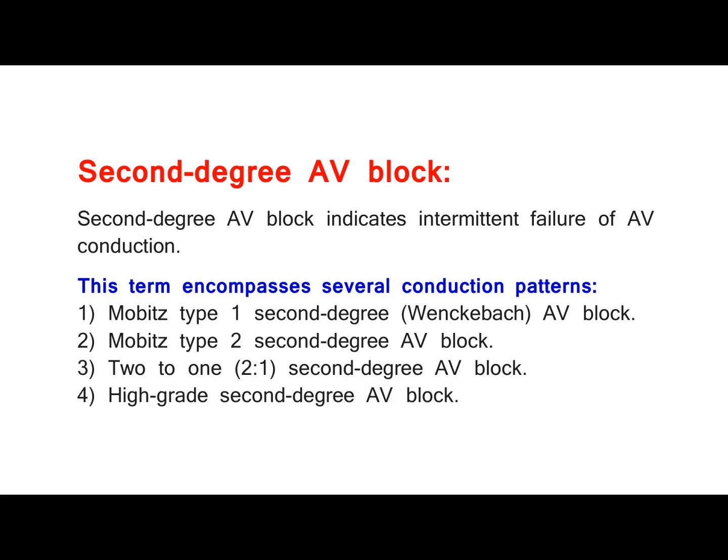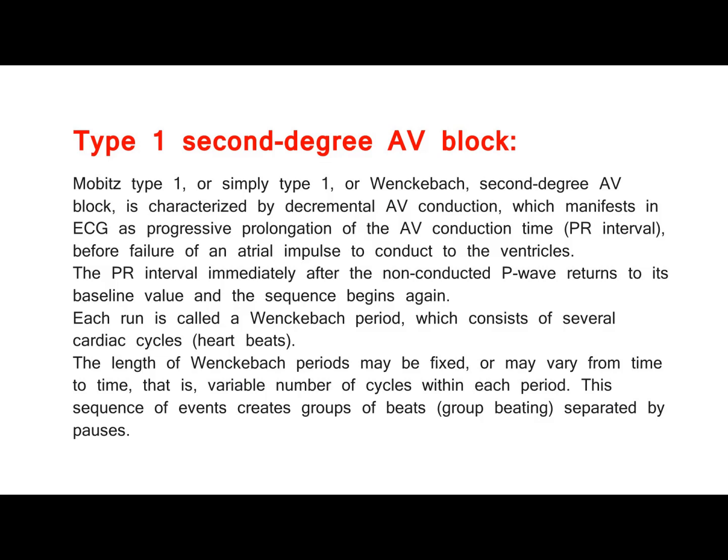1. Mobitz type 1 second degree, Wenckebach, AV block. 2. Mobitz type 2 second degree AV block. 3. 2:1 second degree AV block. 4. High-grade second degree AV block. Type 1 second degree AV block.